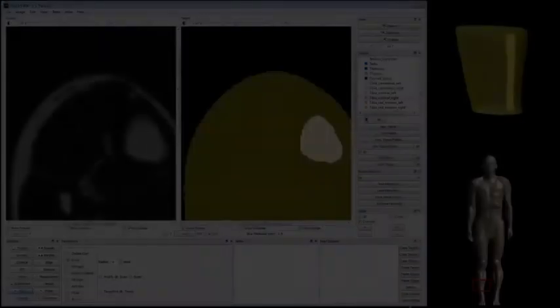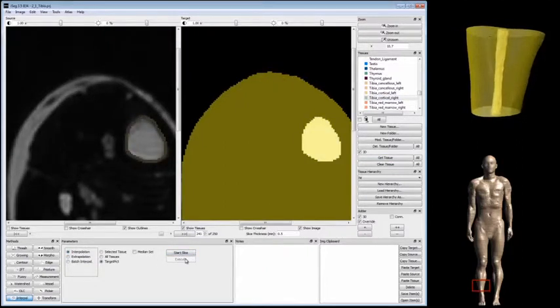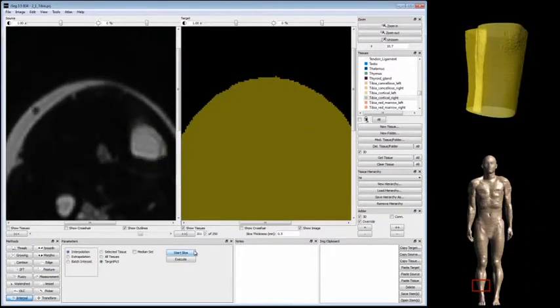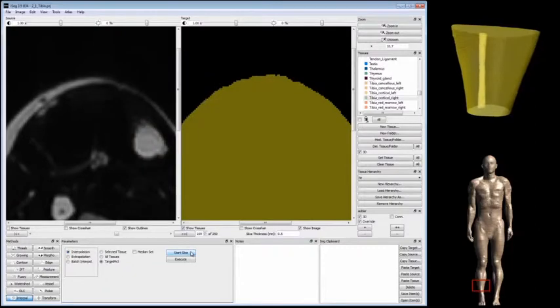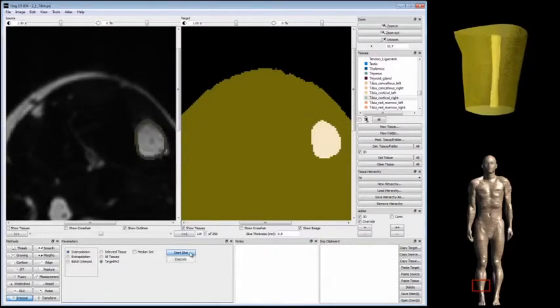Now we come to the second tool involved in the segmentation of the tibia, the interpolation tool. The slices where we have outlined the tibia are employed as start and end points for the interpolation. Interpolation not only saves a lot of time, but also results in a smoother surface of the structure. After interpolating, we can see a continuous structure. The tibia is nearly segmented.